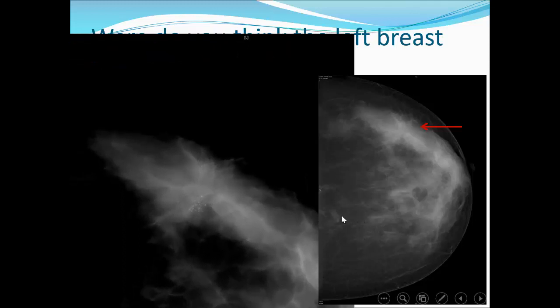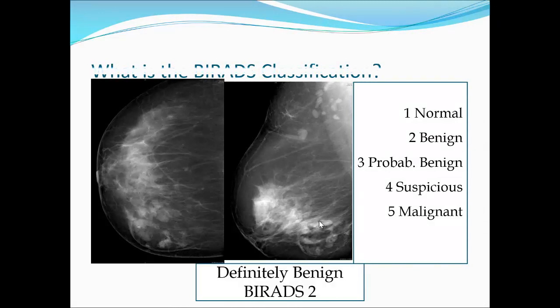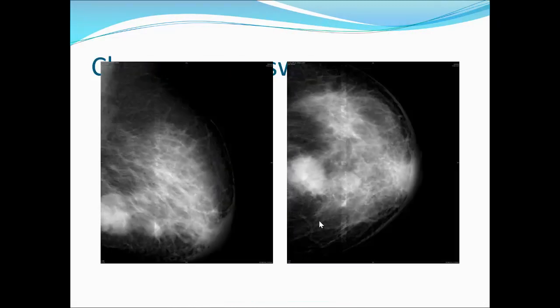Here is the pleomorphic, clustered pleomorphic microcalcifications. Clustered pleomorphic microcalcifications. I think you exhausted the hamartoma type.